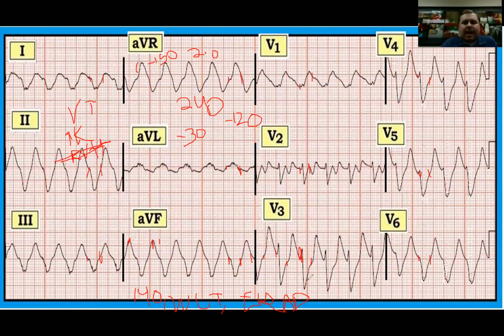And if you just shock a hyperkalemia patient, it's just going to do nothing essentially. Might wake them up if they have any level of awareness. So what you need to know about VTAC is VTAC usually has rates that are 160 and above, so 160 to 220-ish. 140 is kind of the cutoff, so we're kind of right on that line for this 12 lead.